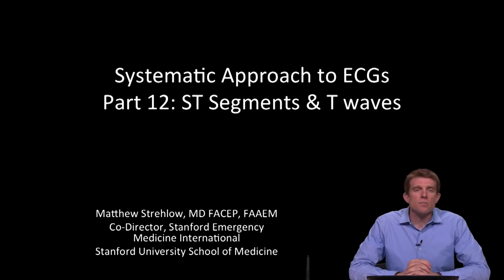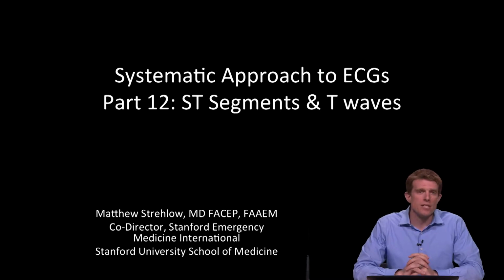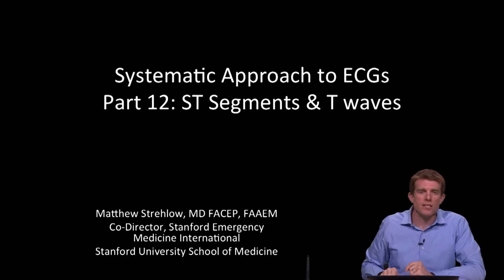Hello, this is part 12 of our systematic approach to ECGs. And in this part we're going to focus on the ST segments and T waves. So this is the final section of our systematic approach when evaluating an ECG.